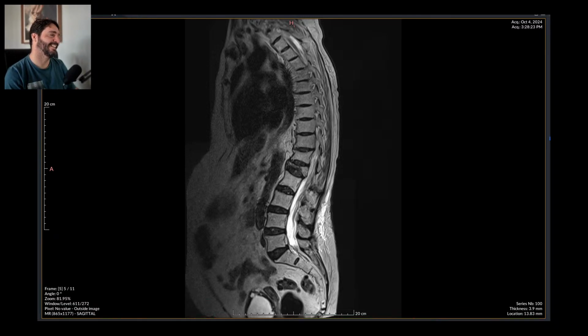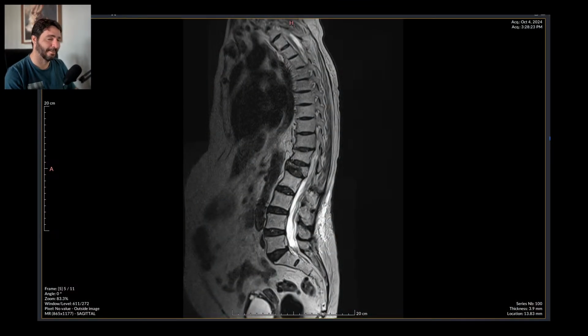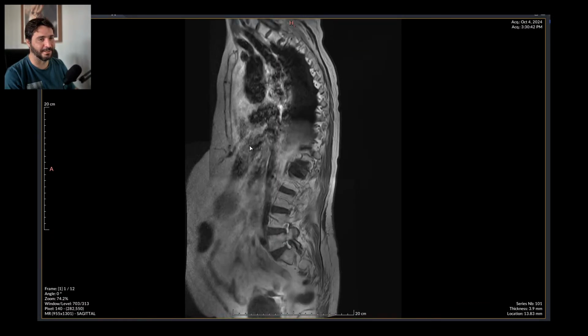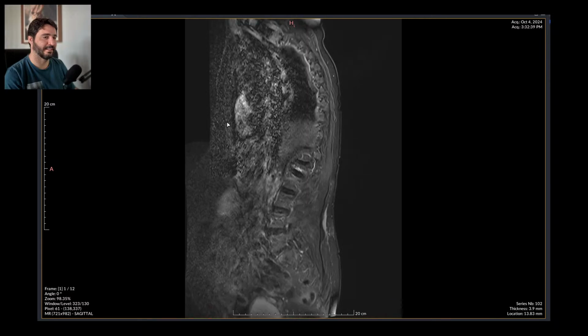I don't know. I can't really. Oh, come on. It's just stupid, man. You just don't do that. Oh my. Who is doing these scans? Come on. This is just stupid. And it's unfinished. They made some kind of sagittal bizarre sequence of the entire spine, and they made no axial acquisitions.